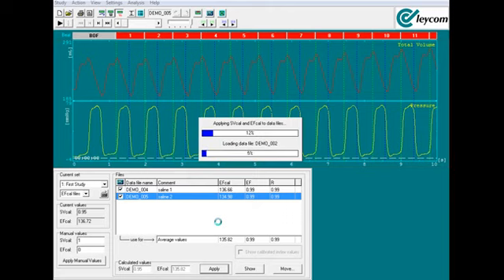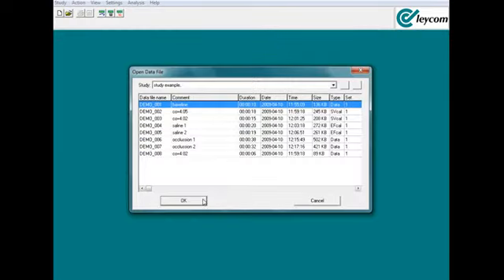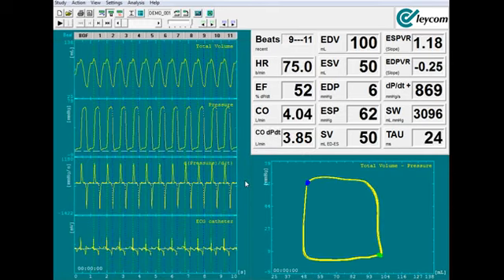After this cycles through, we will double check a baseline file to confirm that our red PV loops have turned to yellow, indicating that the calibration is complete. Here you will see our fully calibrated data. Recall, a yellow signal means that it is fully calibrated and ready for analysis.